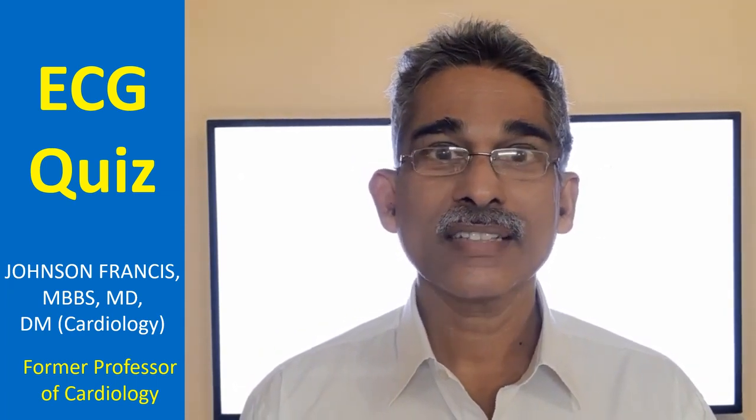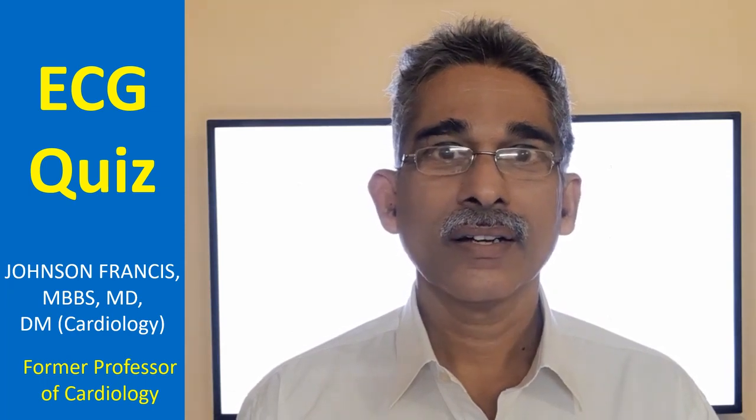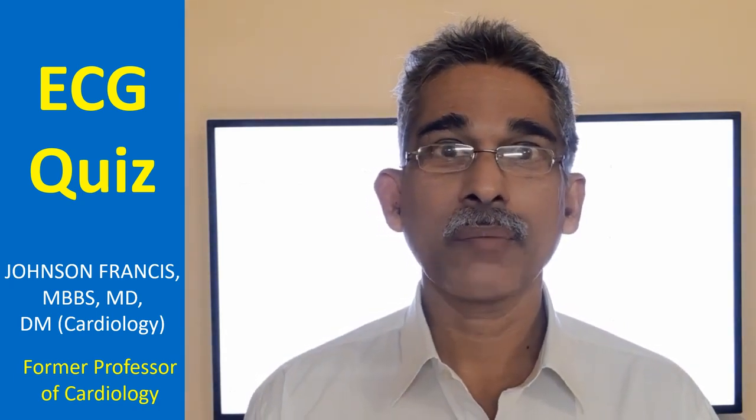Now we'll have an ECG focusing mainly on the rhythm analysis. That's what we are going to see. Clinical history is currently not available. Let us see what we can make out from the ECG.